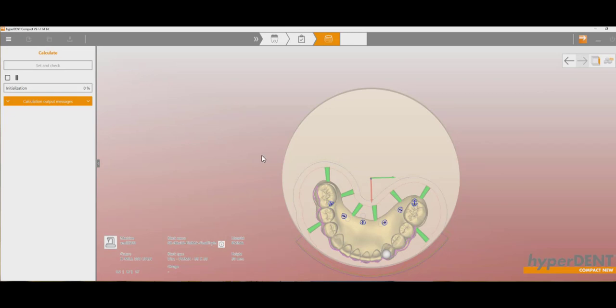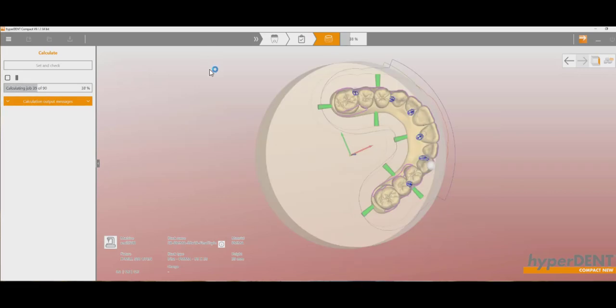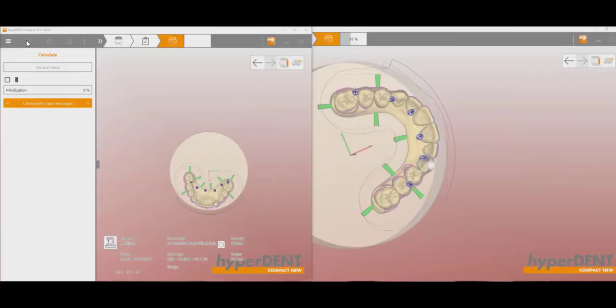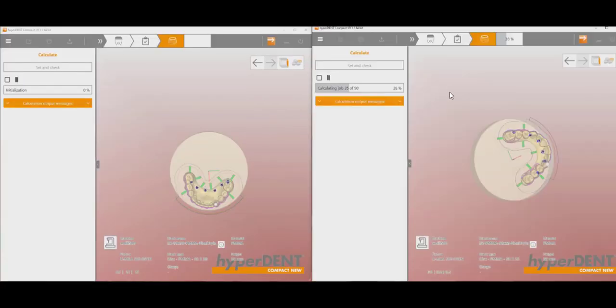So it's nice. There are a few things that can go wrong that you don't necessarily get a warning, so I'm glad that you do on those. So let's see, we'll check on our other case. We're 38%. So we're gonna just grab this one, go this way. So this would be my typical setup here.